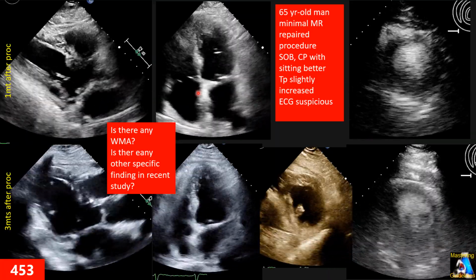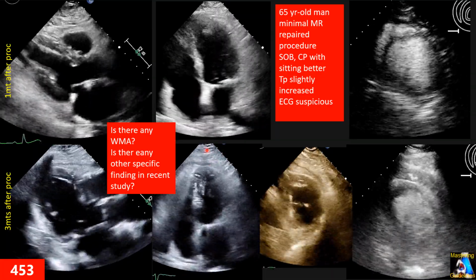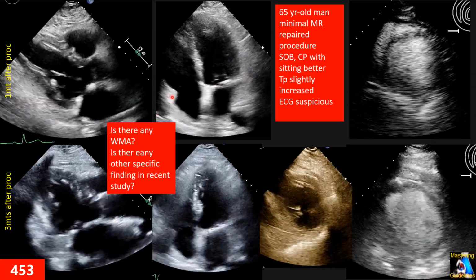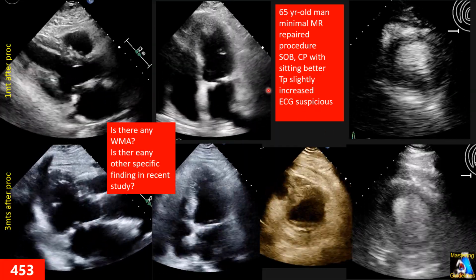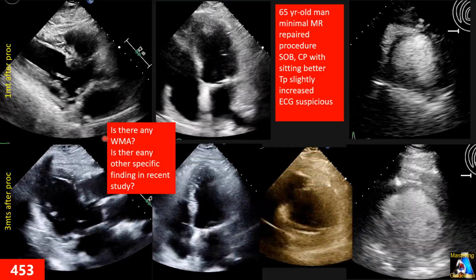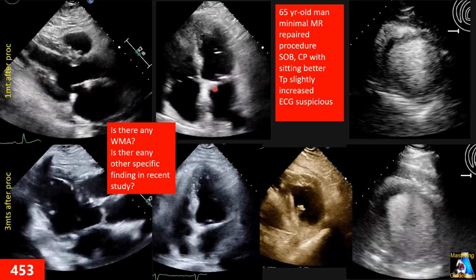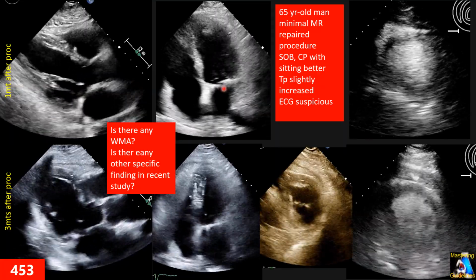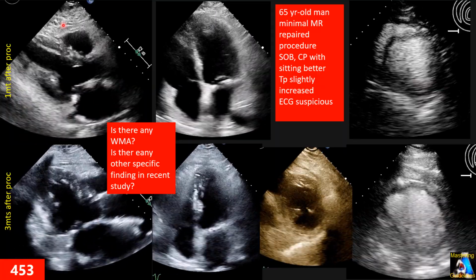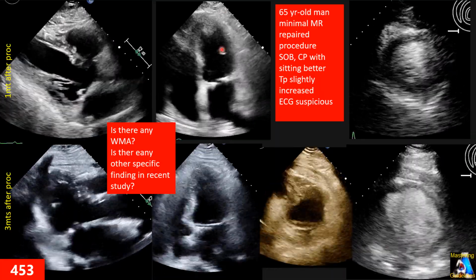Because that finding is important to explain the wall motion abnormality we will see in this case. But you have to keep in mind all these clips, and the clips on the next slides, and based on those we have to come to a conclusion about the cause of that wall motion abnormality. Now let's go to another question.